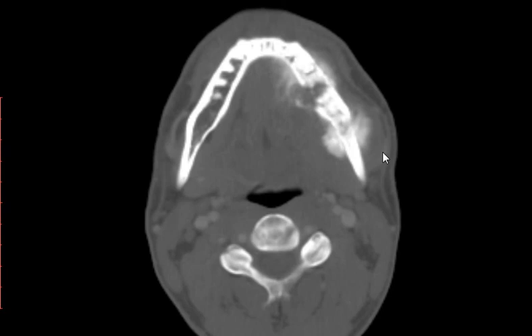Or with some bony abnormality, something with the bone, a big soft tissue mass. Never mind the age, the presentation, the sex. If someone is 35 years old with big soft tissue components surrounding the femur, Ewing. And 99.99% of the time it will be Ewing. Could the differential at the end be osteomyelitis? No.